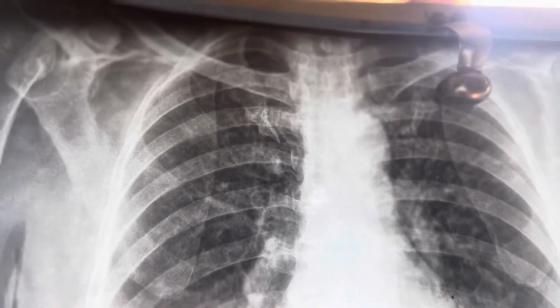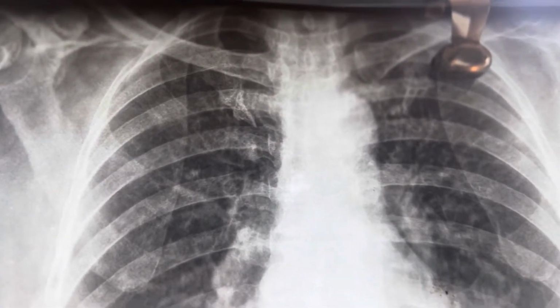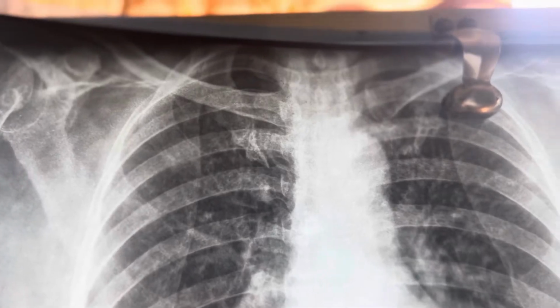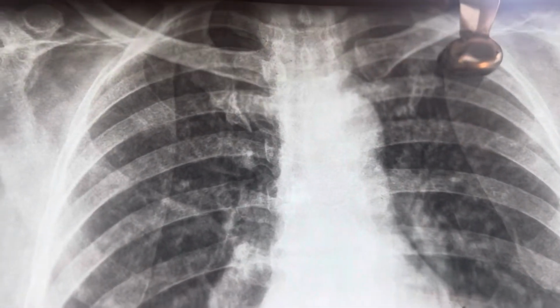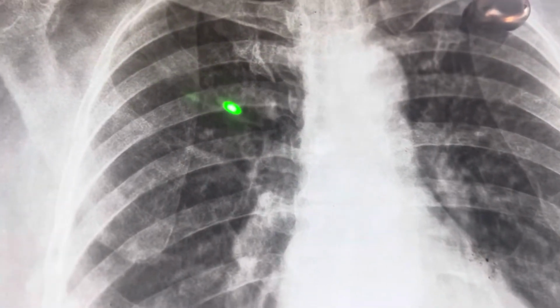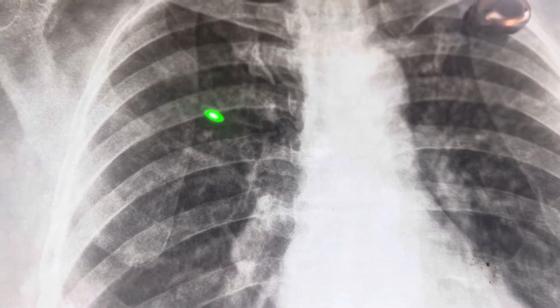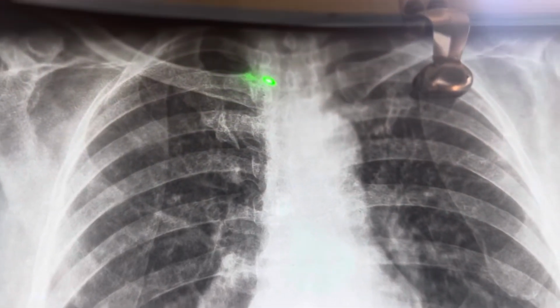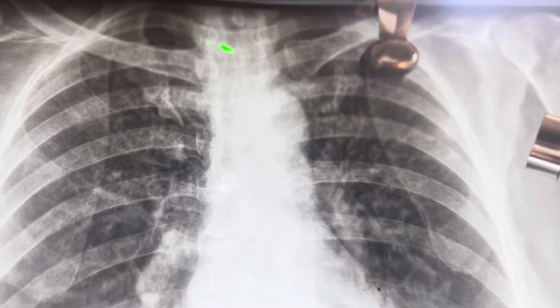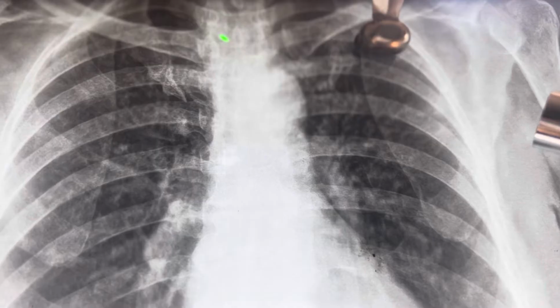After that, we have to identify the hard part and soft part that we can see in this x-ray. There are two things: one is radiolucent and the other is radiopaque. Radiolucent means the thing that you see as black. The all black colored area is the shadow of the lung. And above we can see some air in the trachea. This is the part where the trachea is present and there is some air. So this part is radiolucent.